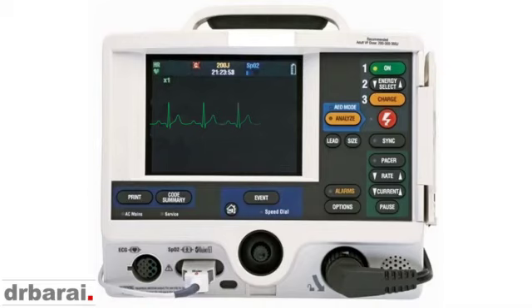A pretty benign condition. It can happen in normal physiological conditions like in athletes. It can happen with some beta blocker, calcium channel blocker drugs. It can happen with myocarditis, myocardial ischemia, and also because of some structural problem like myocardial fibrosis. Most of the time, the first degree heart block is pretty benign.